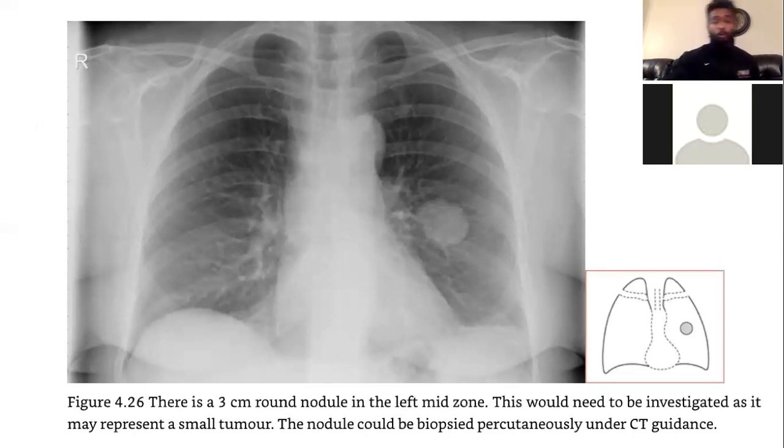Now you know how to localize the lesions. In this one, we can't really tell where it is, because on the left lung you have to see if it's above or below the oblique fissure, and you can only see the oblique fissure on a lateral, like I said, T4, T5 to the anterior third of the diaphragm. But it's not causing a silhouette sign of the heart or the diaphragm, so we can't really say. But anyways, if a nodule is spiculated or has a lobulated look to it, then it suggests malignancy.